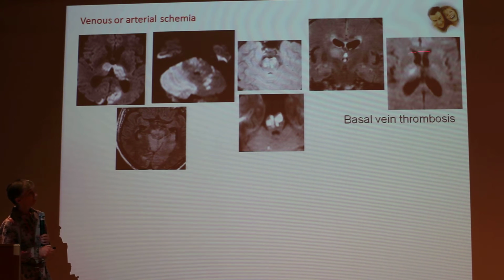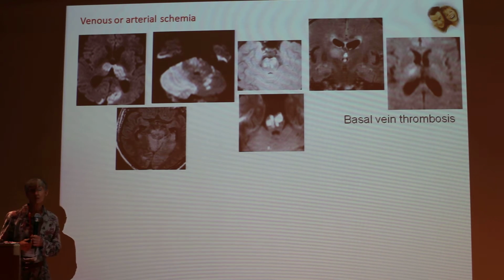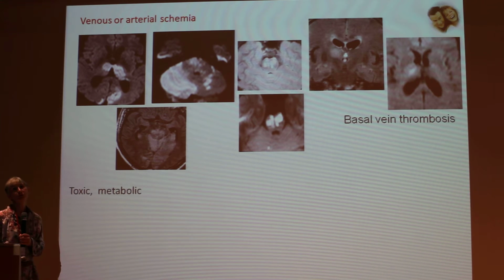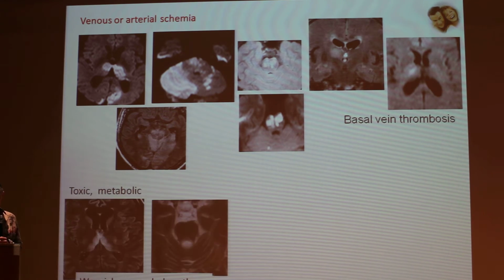And it is very important because the treatment of venous thrombosis is mandatory, even if, like in this case, there is some bleeding. I will just remember that the hematoma due to venous thrombosis are treated by anticoagulation, which is frightening.